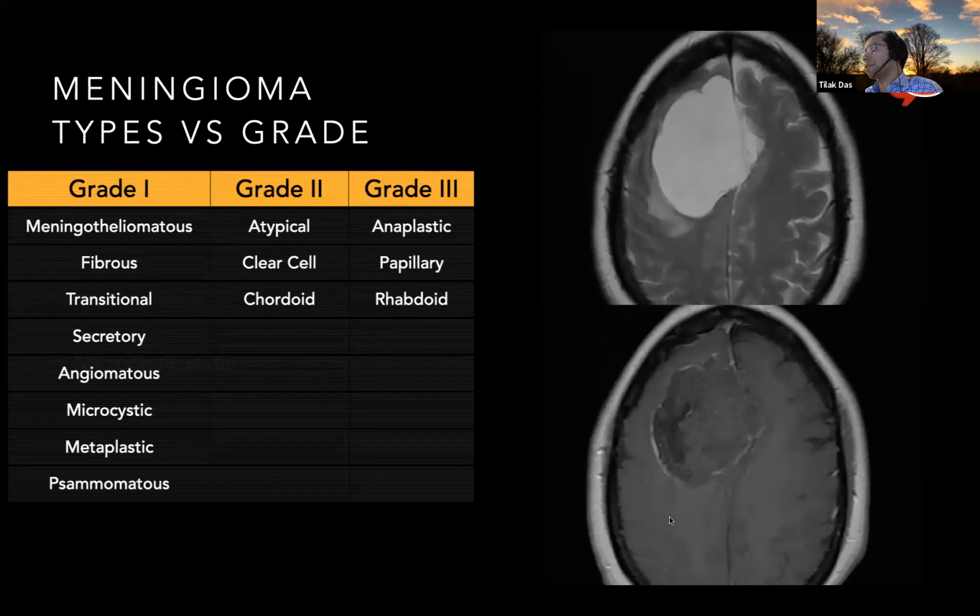It's clearly extra-axial, and post-contrast actually not that avid, not that homogeneous. So any ideas? And of course, this is the game you'd play at the MDT just before the pathologist gets a chance.